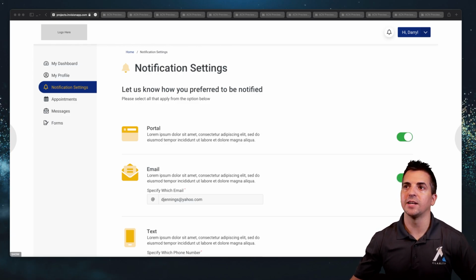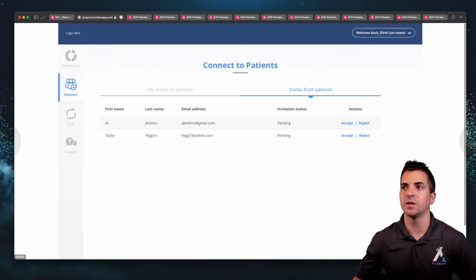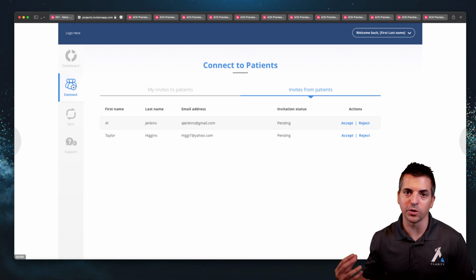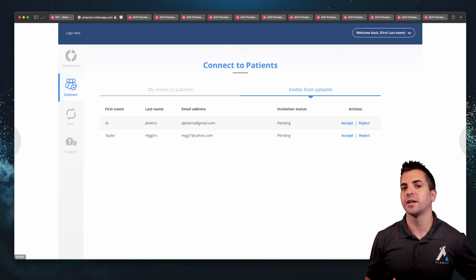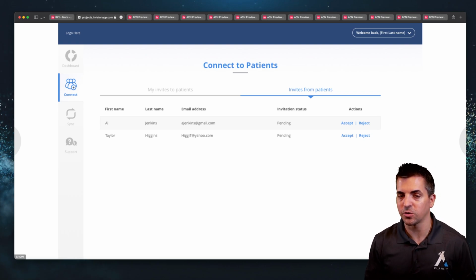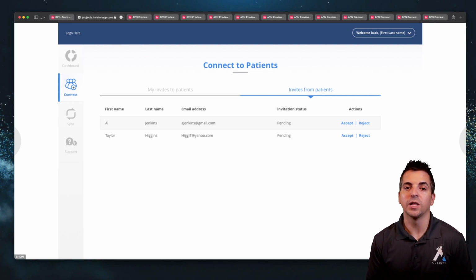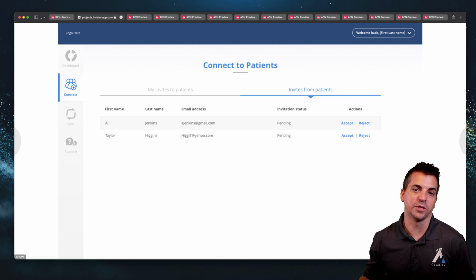Okay, with that said, now let's dive into a specific example. Here in this particular case, we're going to be looking at a Bluetooth glucose meter system, and we're going to be going through some of the different screens, both in the web application, the web portal, as well as the actual mobile and tablet friendly device.